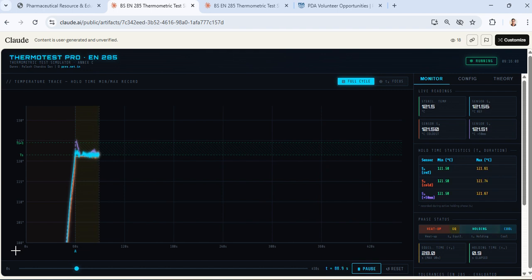Normally we are able to see three dots, and based on the equilibration time, it shows the T2 value at the bottom, which is 28 seconds, our equilibration, and the hold has started here. You could see the hold already started, so you see the equilibration time, and our sterilization hold also started. It's a nice simulation and learning tool, because not everyone has access to an autoclave or the clean room to see how the cycle works.